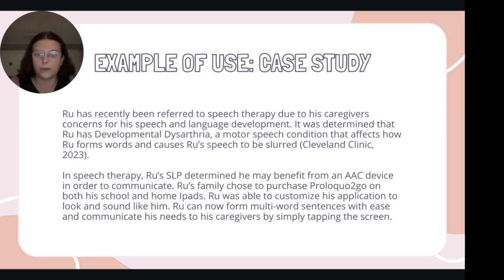In speech therapy, Rue's SLP determined he may benefit from an AAC device in order to communicate. Rue's family chose to purchase Proloquo2Go on both his school and home iPads. Rue was able to customize his application to look and sound like him. Rue can now form multi-word sentences with ease and communicate his needs to his caregivers by simply tapping the screen.